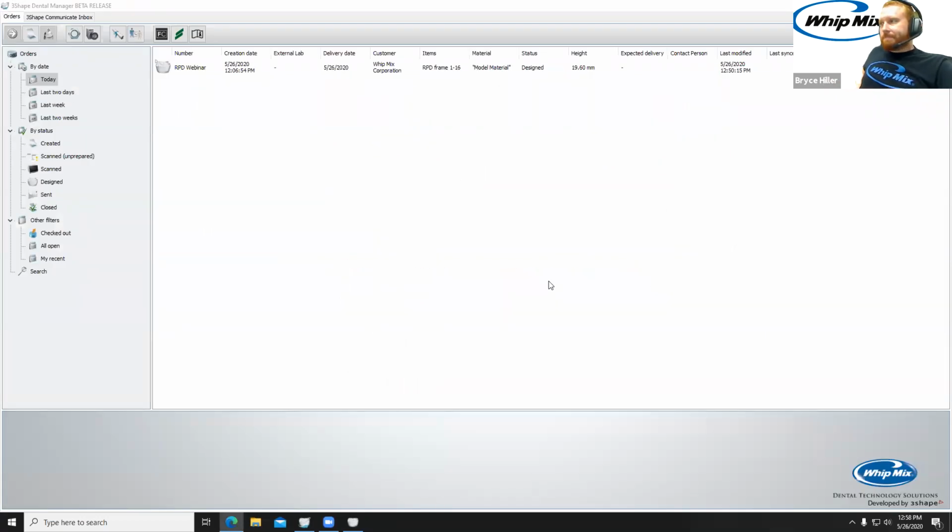Cory, what am I missing? I think you captured really everything from here. Just another side note, I know Bryce said it, but I want to say it again. If you're going in and messing with the control panel, I always make a copy of whichever one I'm going to be messing with. So if I'm changing a rest, or the stippling wax, or whatever it may be, I create a copy of it and then I manipulate the copy. So if I screw up in any way, I can go back to the default and still have my original settings. Just a little tip from there. Beyond that, I think you did a really good job, Bryce.